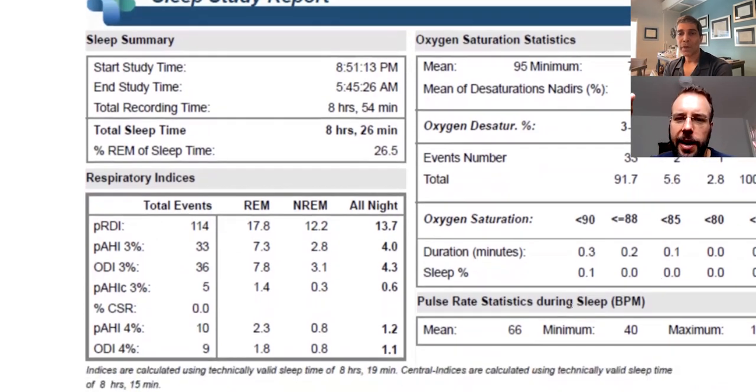Yeah, is what you're saying, like if you have a minimum, let's say that's low, what you're looking for is a bunch of zeros, and then a 1, or something like that, right? It doesn't make sense if it's just a one-off. But it looks like, hey, 18 seconds under 90%, 12 seconds under 88%, and 6 seconds under 85%. Well, that makes sense, right?